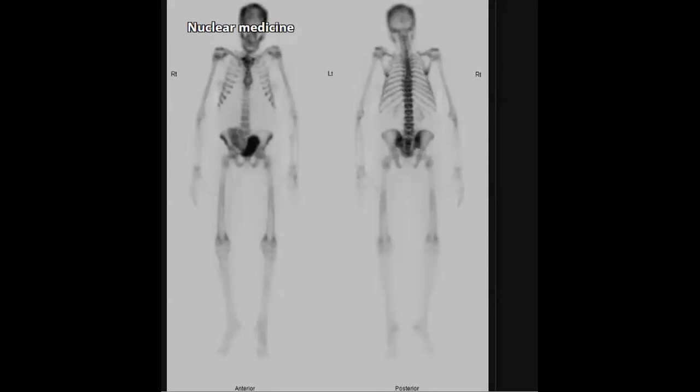Yes, transplanted kidney. Maybe pelvic kidney. But do you agree that it could be transplanted kidney? Yes or no? Yes. What do you think about the appearance of the spine? Typical for something in your mind. The spine in this case. What do you think?